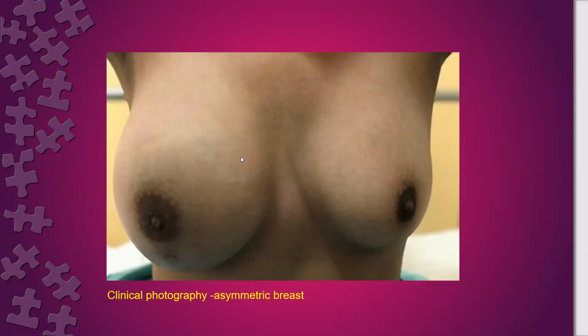Mastitis is okay. Tumor also. Yes, it can be fibroepithelial. It can be fibrocystic adenosis. It can be fibroepithelial, giant fibroadenoma, phyllodes tumor, and it can be neoplastic, though there are no obvious features. But if you look here, the skin is normal. And that was strange. She has breast angiosarcoma, which is relatively rare.